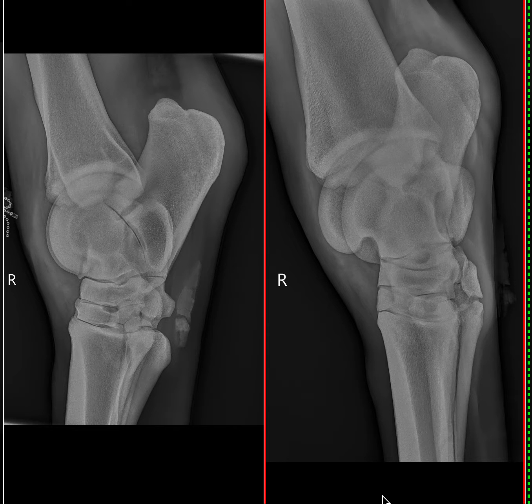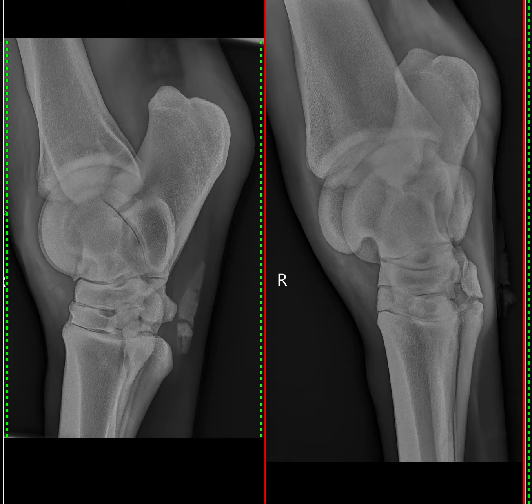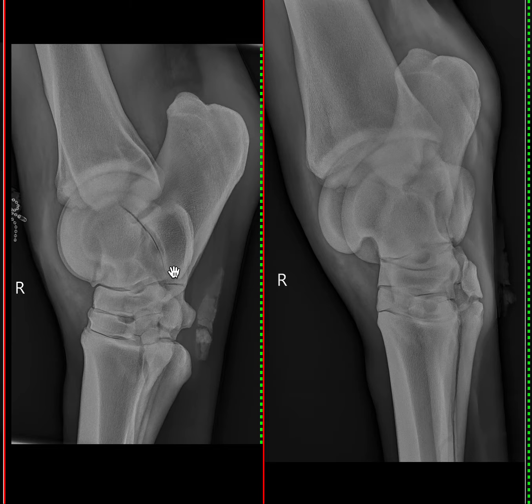So today's case is a 4-year-old Thoroughbred Mare who has been noted to be mildly right hind limb lame with a swelling of the tarsocrural joint. So I hope by this point you've all systematically looked at your x-rays and generated your own reports. I'm going to highlight the most important findings that I think are relevant in this case and hopefully discuss some of the more common manifestations of this disease.